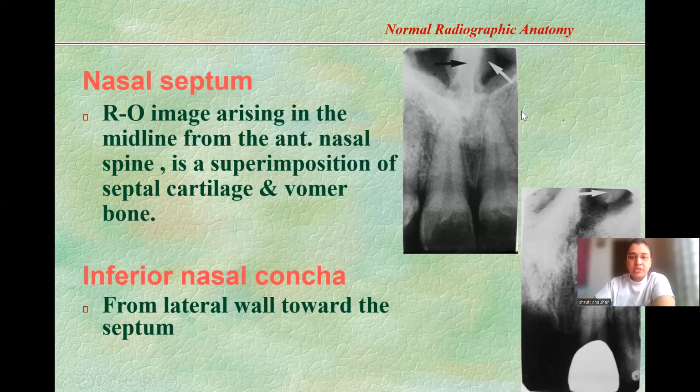So you can just mention it, but mostly if you want to see something, it will be seen in the occlusal radiograph. So these are two radiolucent areas above the apices of the central incisors in the nasal cavity floor on both sides of the septum, that are round or ovoid in shape. And where are they seen? They're seen above the apex of the central incisors. Easy?